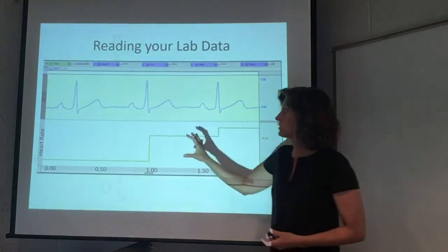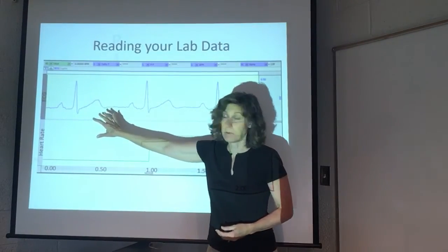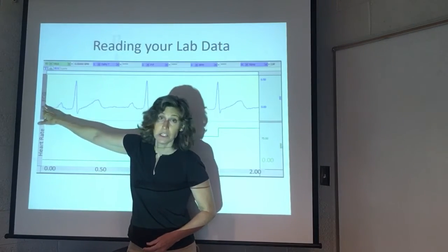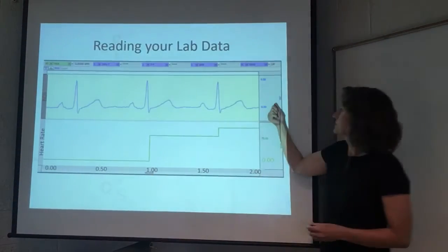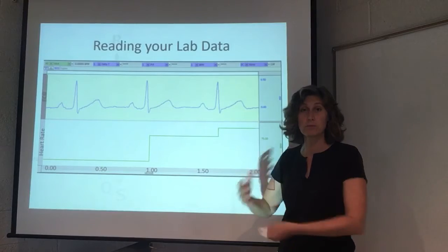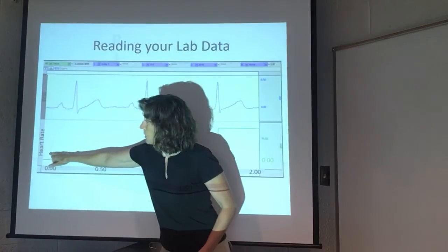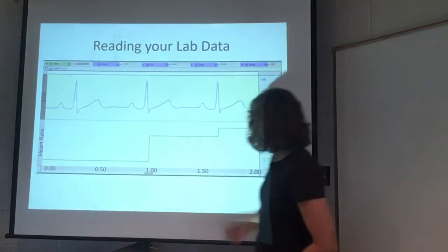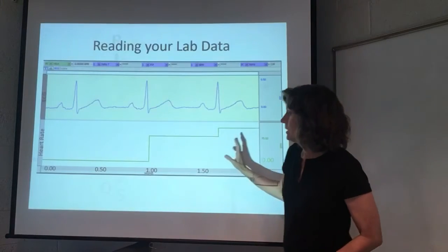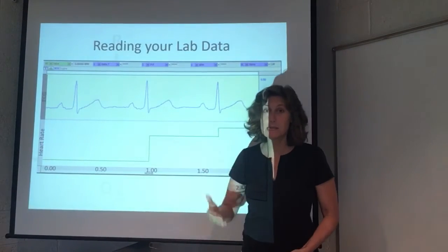Okay, changing gears a tiny bit. As you're reading your electrocardiogram, it's going to show you a channel that shows ECG, okay? And this is in millivolts. This is actually how much electricity is coming out of the heart and being received at the surface of the skin at that point. Then down below it is the heart rate, which again, I challenge you, should be measured in beats per minute.